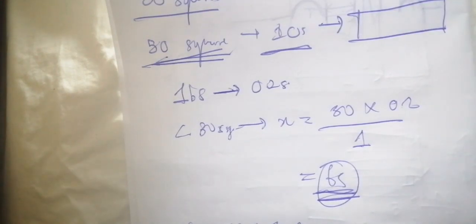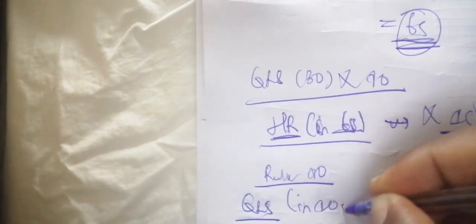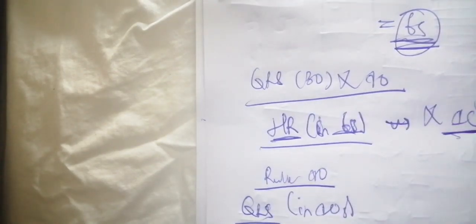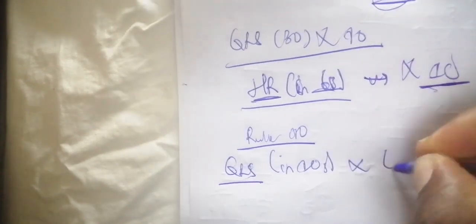So when you are given a whole ECG slip, that corresponds to 50 big squares. So when you visualize QRS complexes in 50 big squares, it corresponds to QRS complexes in 10 seconds. Is it clear? And that is just a heart rate in 10 seconds. So to convert a heart rate in 10 seconds to a heart rate in 60 seconds, you multiply by 6. That is why in the rule of 10 you multiply by 6, and in the rule of 6 you multiply by 10.